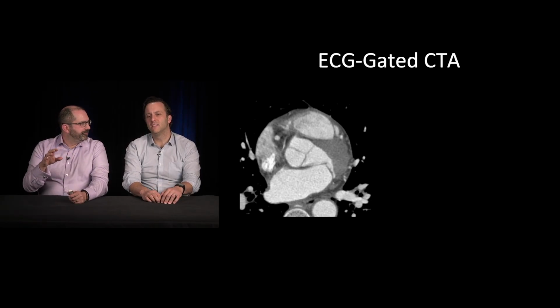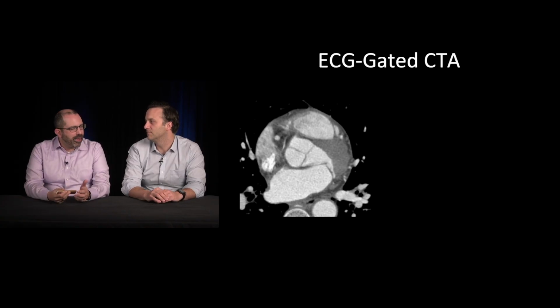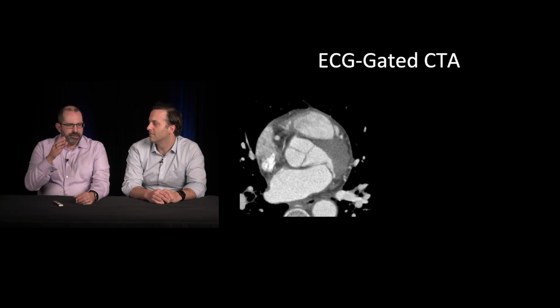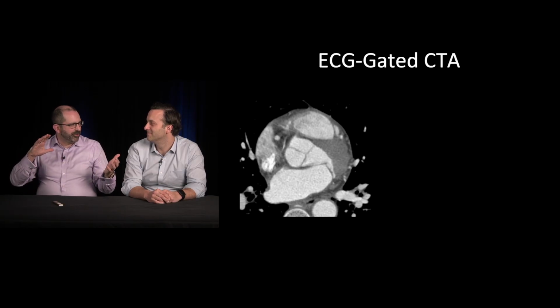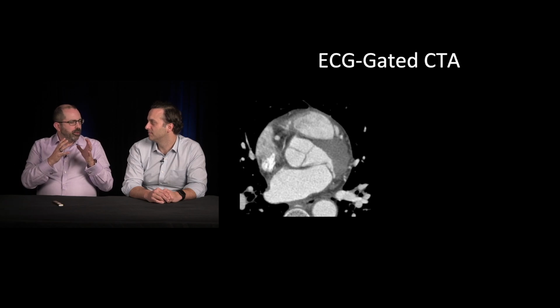Have you heard of this? This is when they time it with the heart motion, correct? Yeah, so it's fascinating technology. Basically they take the patient and use EKG leads and hook them up to the CT table. And what it then does is it acquires images at the same point in the cardiac cycle based on their EKG. That's crazy. And then the computer, through the magic of science, squishes them all together and creates a very clean image that essentially eliminates motion artifact.